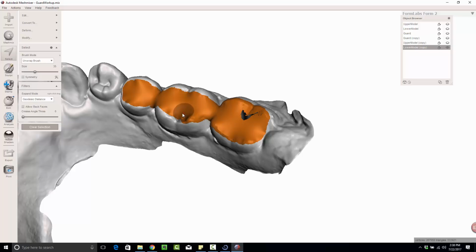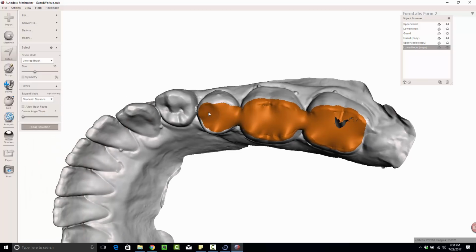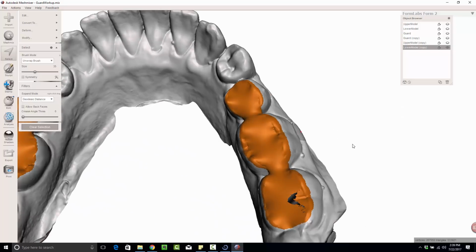That's a very useful tool to be aware of. Another reason why I like to do multiple clicks, because if I just drag this and I need to undo a small part of it, it's going to undo everything. Sometimes it's okay. Dragging is certainly faster, but if you're not sure and you're afraid you're going to fall off and accidentally go a little too much, I wouldn't drag a lot, maybe once per area.